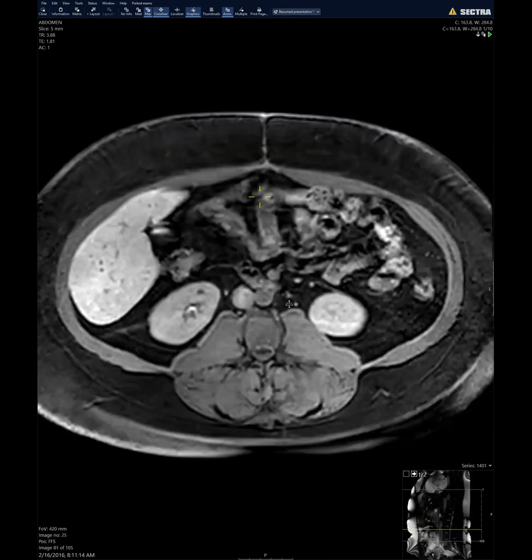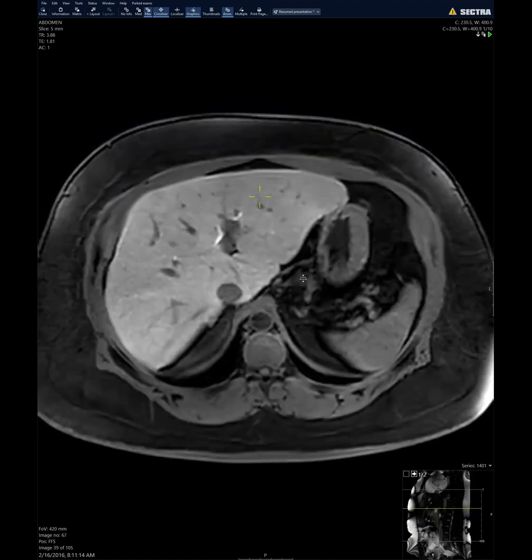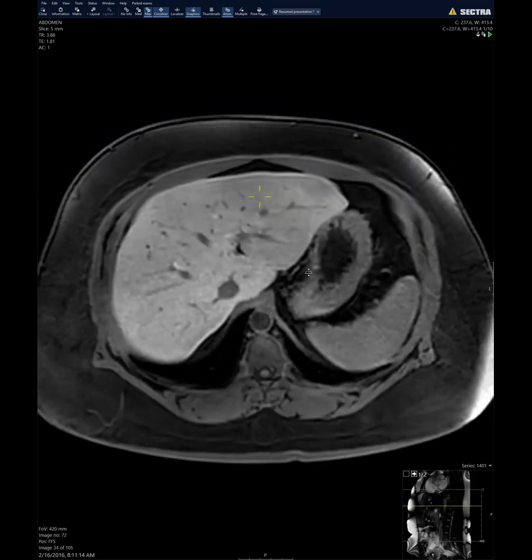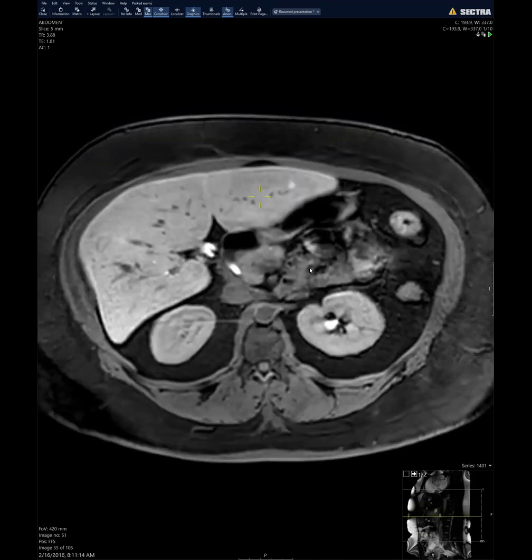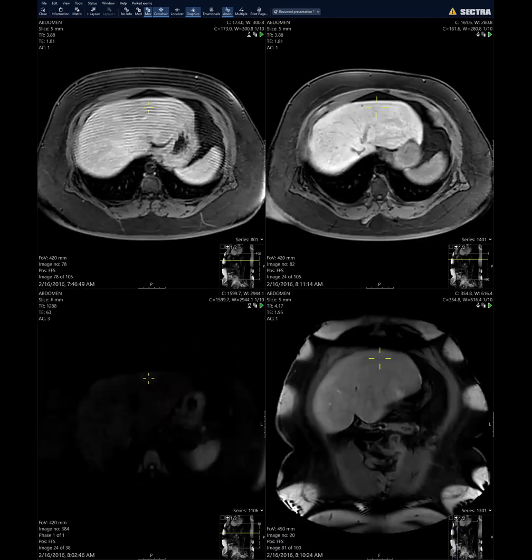So we're debating washout. This makes it look like FNHs, but how could you differentiate that from nodular fatty sparing? Well, you can't. I guess the only suggestion is that the larger FNHs are probably more likely to have central scars than not. Also, look at subtraction and see if on the arterial phase there's real hyperenhancement, or it's just a little higher signal because of the fat suppression of the background.